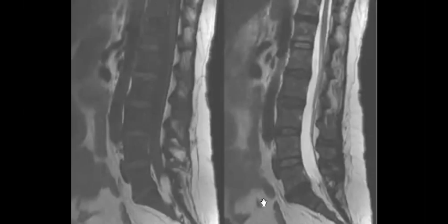Perfect. So metastasis and myeloma, multiple myeloma, lymphoma and leukemia. And if you mention lymphoma, then it's good to mention that you will search for any associated lymphadenopathy, splenomegaly, and so on.